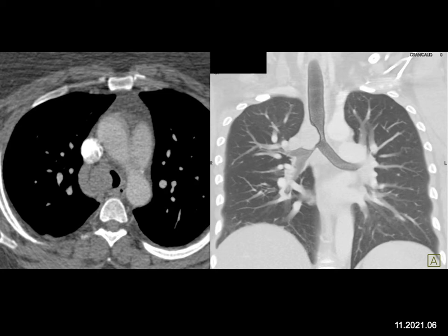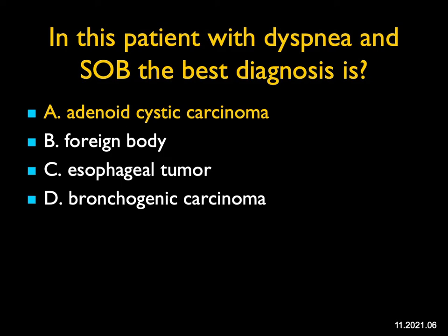You can see all sorts of tracheal filling defects, from pseudotumors to foreign bodies to primary malignancies, like in this case, to certain unusual benign tumors like hemangioma, chondromas, or papillomas. You can think about direct invasion from a lung cancer, or when they're multiple, as I mentioned, metastasis theoretically, or laryngeal tracheal papillomatosis. It's a very nice differential diagnosis. In this case was an adenoid cystic neoplasm.